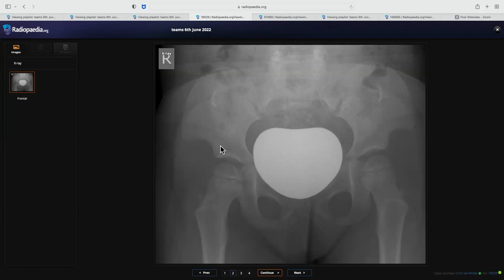You are right that it's a congenital problem. But is there any other congenital problem you can think of? Have a relook at the iliac bones. I can see sclerosis or hyperdense areas in the bilateral iliac bones. I think they are iliac horns. Okay. So bilateral iliac horns are seen in Nail-patella syndrome. Now can you see that X-ray?